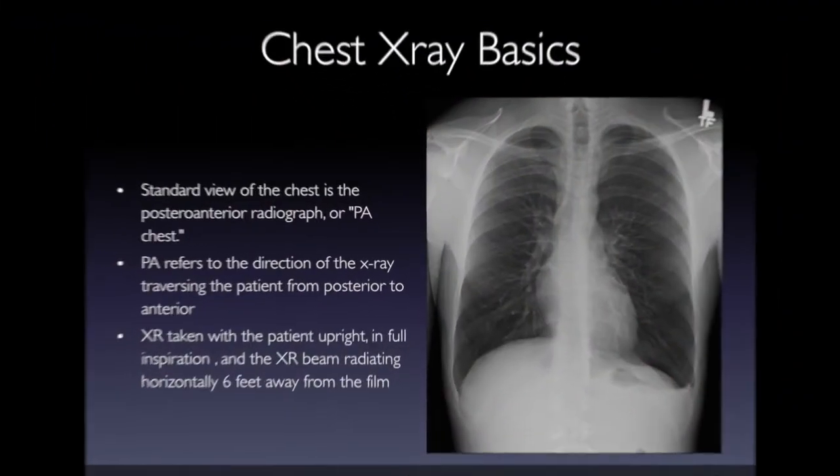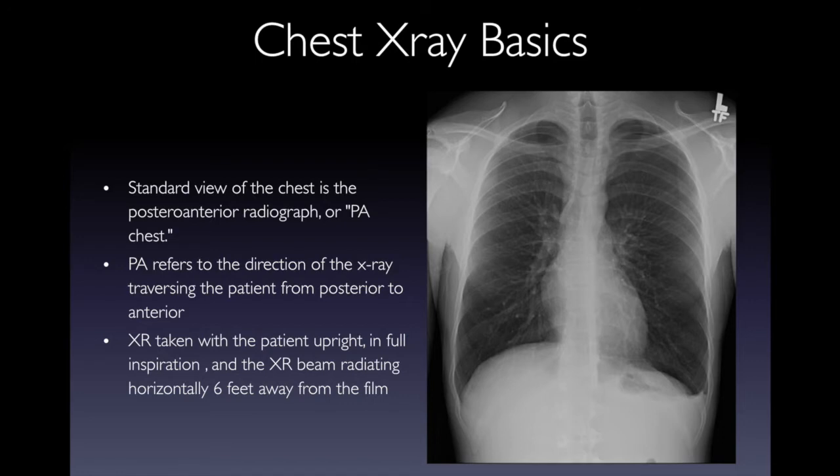For success in radiology and reading x-rays, it is important to know which views you need, know which films are good ones versus bad ones, and not accept inadequate films. Also, you want to read in a methodical pattern, and that's important to make sure you're not missing any known common lesions, but also you want to know some commonly missed lesions. And when in doubt, you can phone a friend and call the radiologist if you are struggling with a film or there are any questions that are coming up. So the first film we're going to start with is our standard PA chest x-ray.